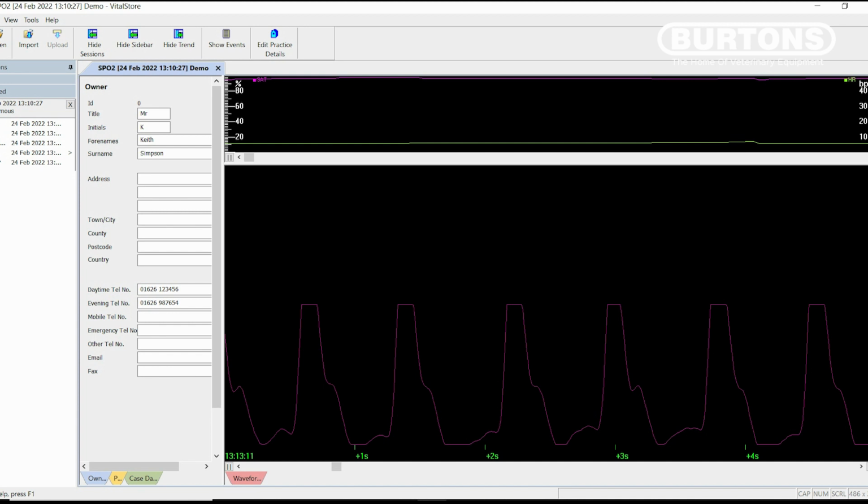If we were to basically just export trend data, so SpO2 saturation or heart rate data, then we'd be able to recreate the trend. So there are many options for research purposes or evaluation purposes or data sharing purposes where you may want to export all the data in a CSV format.